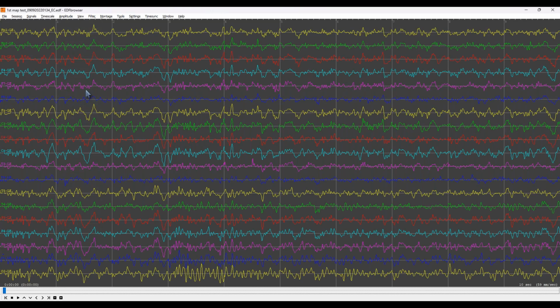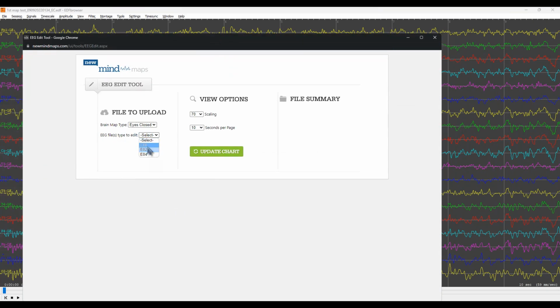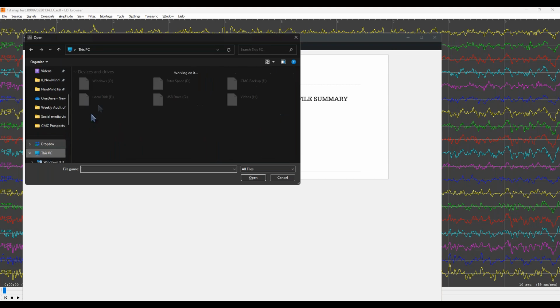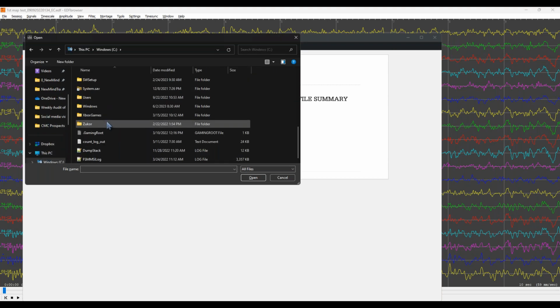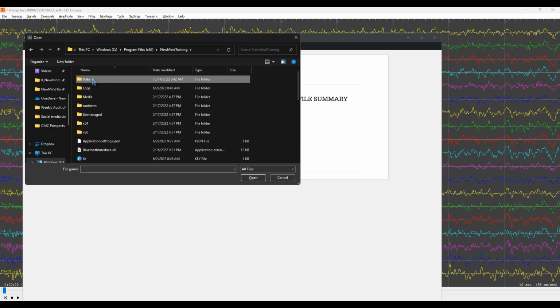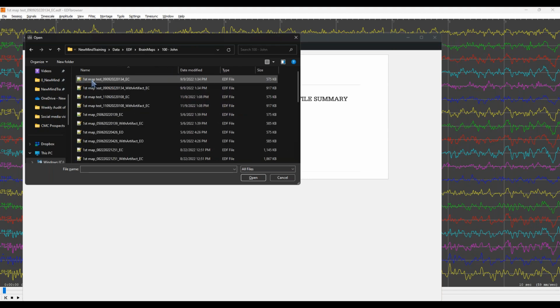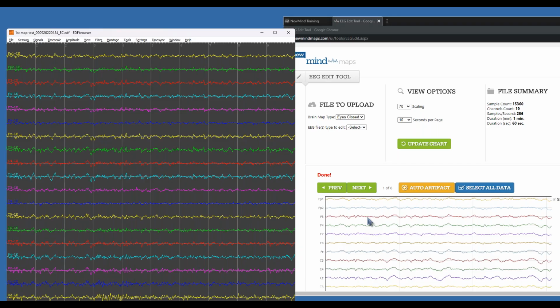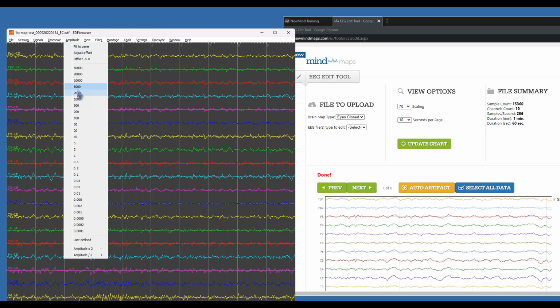Now, if you wanted to review, let's say, a map, let's see if we can get up the same map in two different ones. So let's go to brain maps. Go to this guy. So let's bring this one up. What is 99? So this one over here, I've got the amplitude turned up.